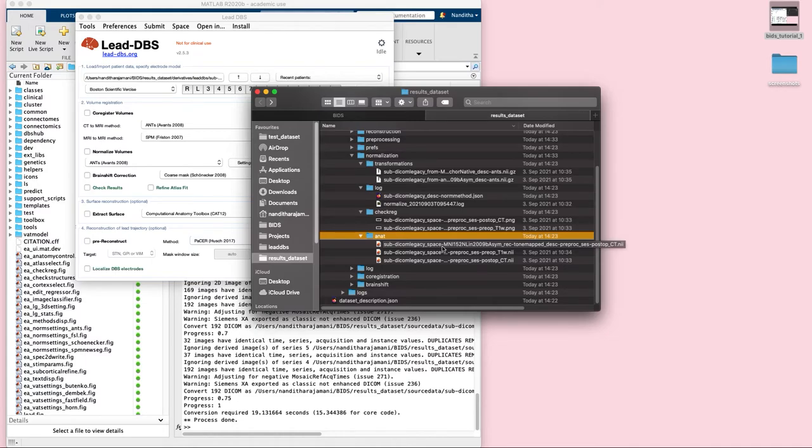The rec stands for reconstruction algorithm. This tag is not obligatory in every single file name. It is used here because another additional step of tone mapping has been done to the post-op CT, and therefore it is used to describe the file. And desc is the description, so that here is preproc, which means that this particular file has been obtained from the preprocessing folder. And then the session is of course post-op, modality is CT, etc.